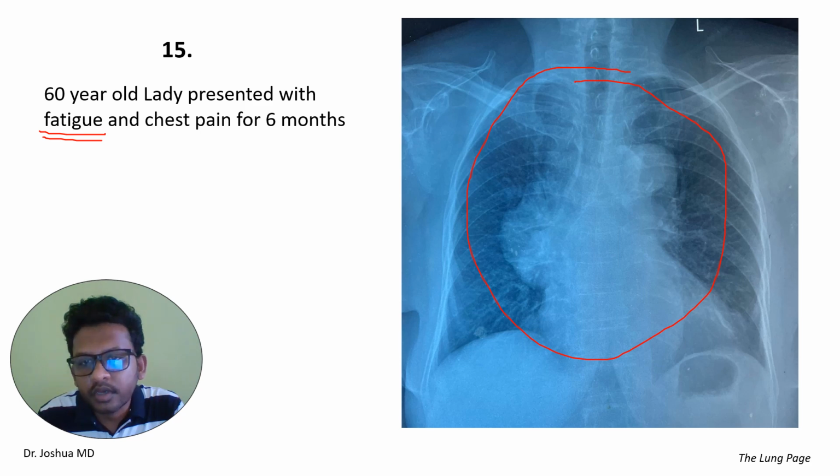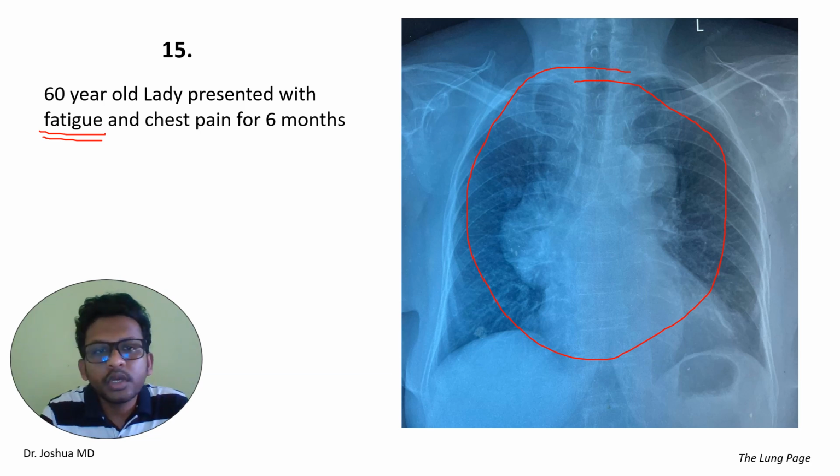You can see a lobulated mass-like lesion in the mediastinum, and also you can see very clearly the hilar structures over this mediastinal mass. So this is called the hilum overlay sign. I told you previously it may be anterior or posterior or sometimes lymphadenopathy. There's a mediastinal mass-like lesion. So for confirmation we took a lateral.